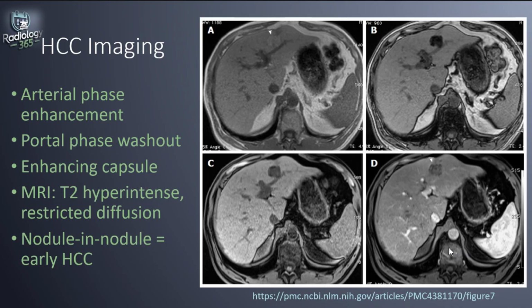And there is a prominent left hepatic nodule which demonstrates minimally increased intrinsic T1 signal. It's minimally increased here, as seen with the arrowhead, and low signal intensity on the opposed phase. So it has a signal drop on opposed phase, indicating some intracellular fat component.